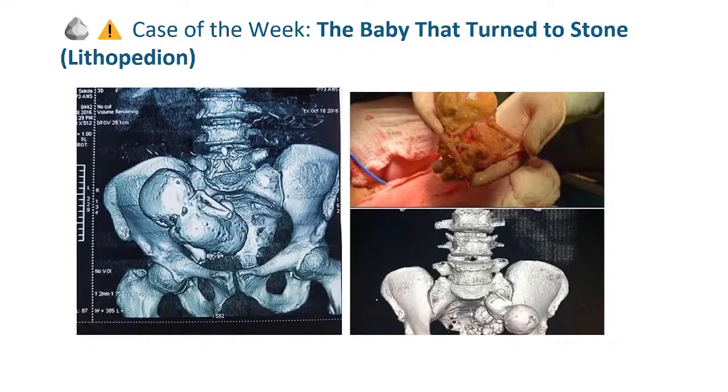So this is a very fascinating presentation and a very fascinating case that I have never seen before in the history of my career. So fasten your belts and let's get to business. So this is the case of the week, the babe that turned into stone, which is called the lithopedion.